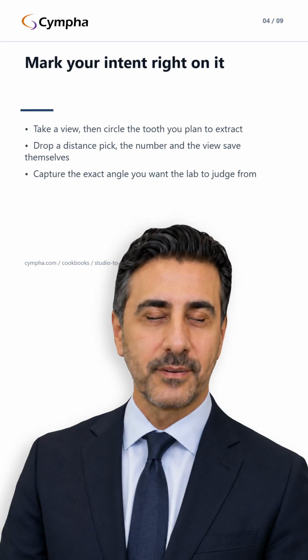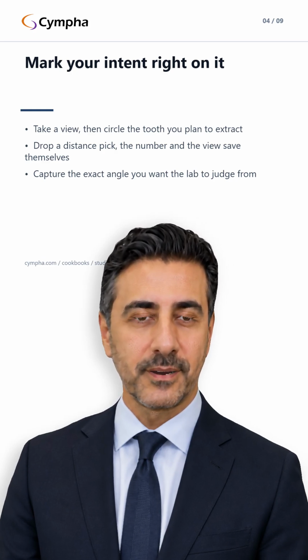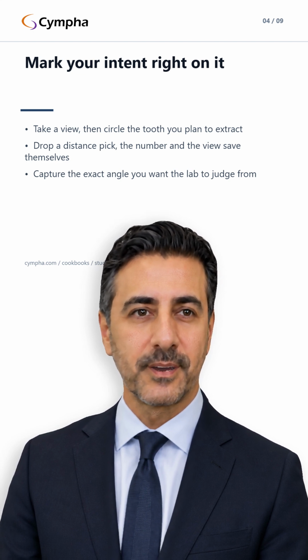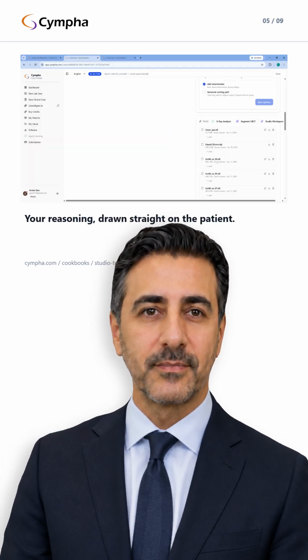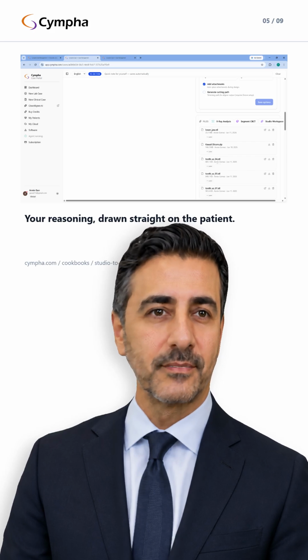Then you record what is in your head straight onto the case. Take a capture of the view that shows it, then circle the tooth on that picture, a red ring the lab cannot miss. Measure a distance, and Studio quietly saves the picture of that measurement, the value written right on it, so nobody remeasures it from the wrong angle. Point the camera where you want them to look. None of it has to be translated into text.